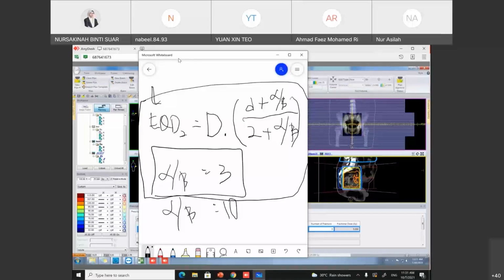When you do your plan, we need to evaluate the DVH. Later I will show you another example of how to do this. For now, let's go back to our plan first.